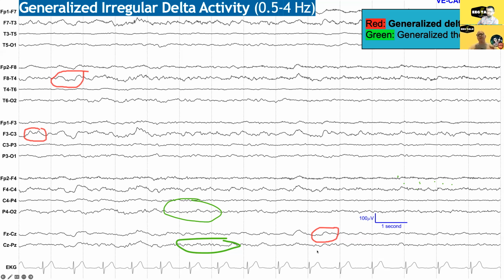And so in a report, you just do what we're saying. You can sometimes say what the dominant one is if you want to convey to someone what you're seeing. So, predominantly delta slowing with admixed theta and alpha oscillations.